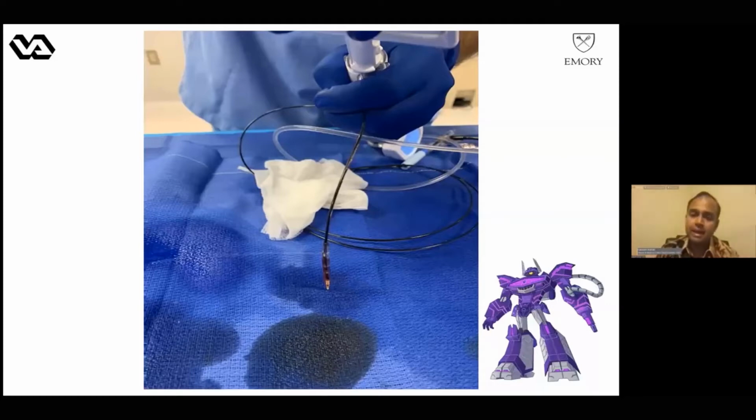We never made it higher than 3 atmospheres. And this was our first area that we treated. Now, subsequently, we've had a few ruptures with the coronary shock wave as well. And they have been generally with more treatments.